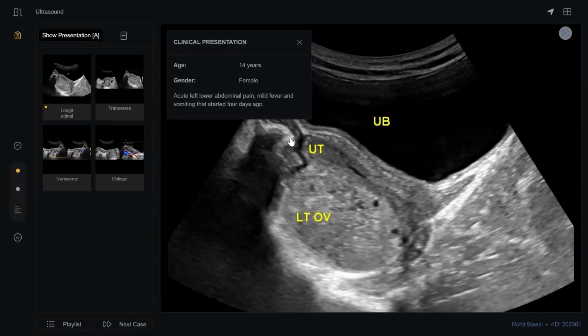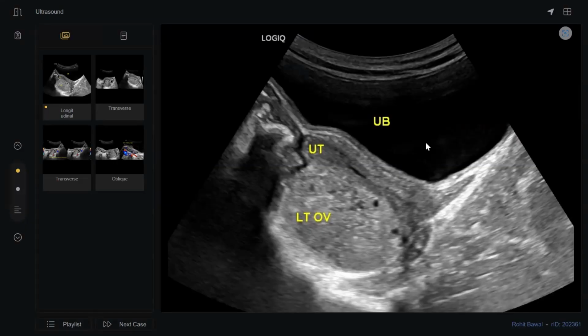Hello? Yeah, hello, can you hear me, sir? Yes. Sir, I have requested for remote control. Yeah, go on. Okay, these are grayscale. I think this is single image.